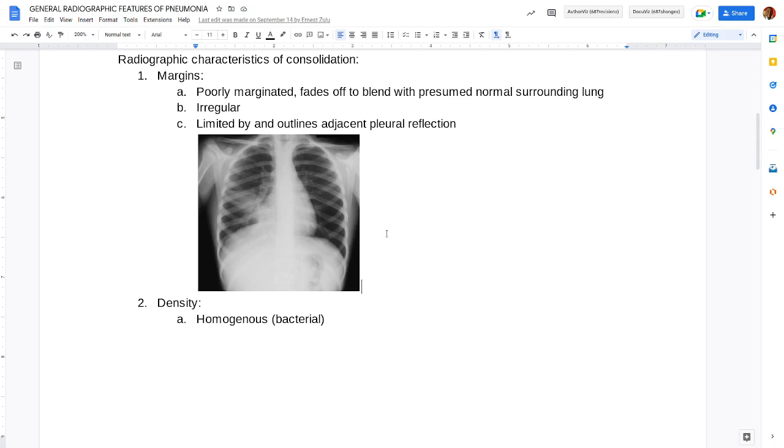It will be very white in the middle. As you go to the periphery of that patch, it will start getting less white, and then a shade of black comes in, so there's a mixture of white and black to some level of gray, until you end up in the normal tissue, which should be completely dark, the way a normal lung should look.